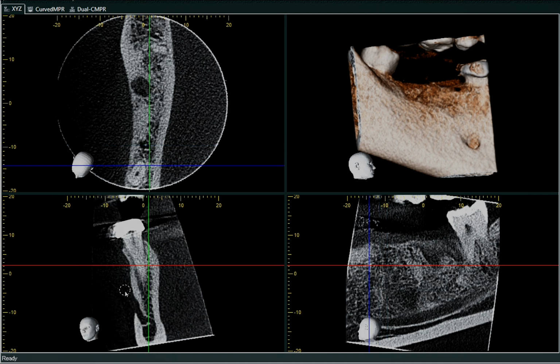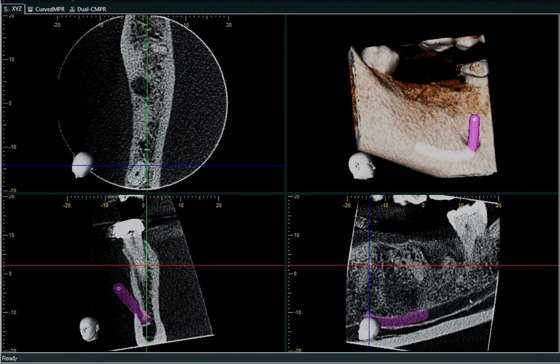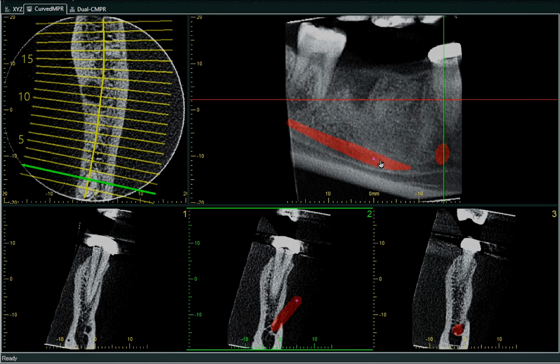Going to the nerve canal cortex, there's the mental foramen region, which is on the buccal aspect, so it ends over here, and you just have to go posteriorly. Using the mouse scroller button, you can go in the posterior region, and it goes towards the lingual aspect and ends in the lingula. Okay, so we can give this red color or any color you like, and this is how it appears.